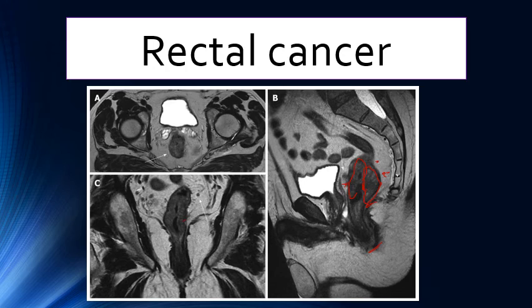Here is the lateral wall, so there is an annular carcinoma affecting the rectum from here to here, and we can see here there is a shoulder and a shoulder here. This part is malignant, and we can see also there are small lymph nodes here. And another one may be affecting here, and this is the appearance of rectal cancer in the MRI. So the MRI is better for rectal cancer delineation even without IV contrast for evaluation of this rectal cancer.